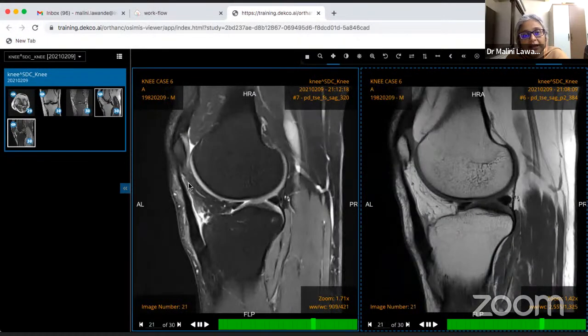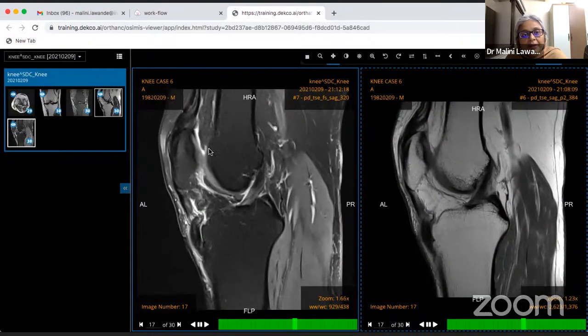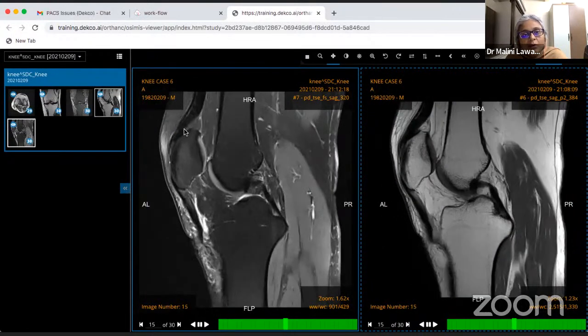More often, we get lateral infrapatellar Hoffa's fat pad edema, which can be seen with friction between the patellar tendon and the lateral femoral condyle, and that suggests patellar maltracking. We may also get edema in the quadriceps fat pad. This is the quadriceps fat pad, this triangular structure. This is normal, you may have bright signal there. It may be swollen, and that could be quadriceps fat pad impingement.